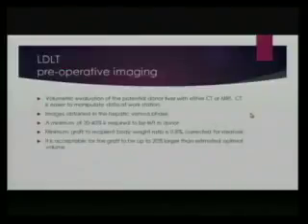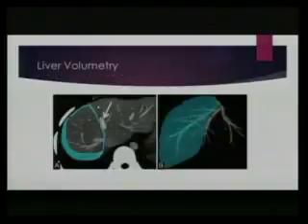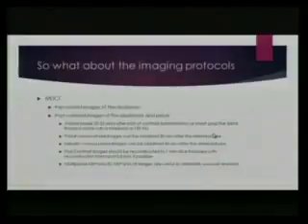If you're trying to determine the volume of the right hepatic lobe, then you're going to want to go just to the right of the middle hepatic vein. So you want to do it based on the hepatic venous structures. So this is an example of that. They're basically showing how they did essentially a virtual hepatectomy or partial hepatectomy for the surgeon so they could see the volume of the segment.